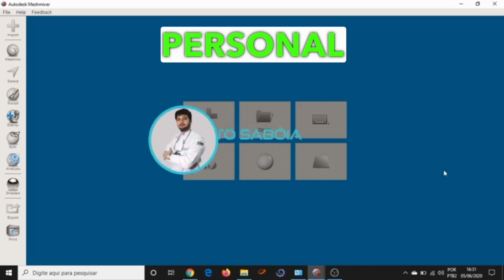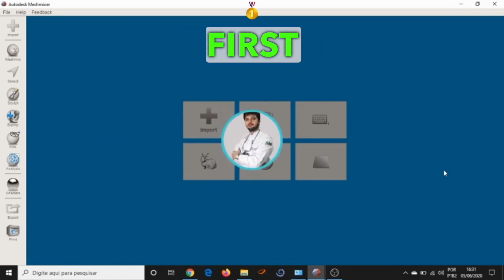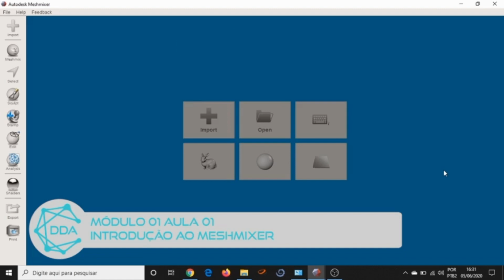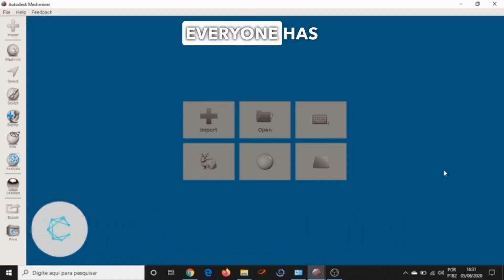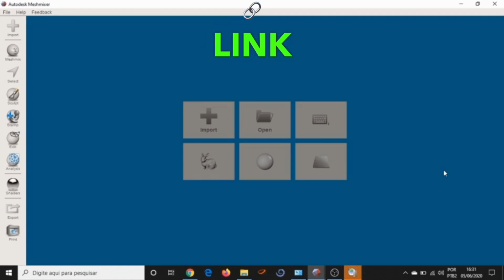I'm part of the Personal 3D team, and I'm excited to present lesson 1 of the first module of our Autodesk Meshmixer software course. I hope everyone has already downloaded the software. If not, we'll leave the link where you can access this software, which is really easy to install, use, and so on.